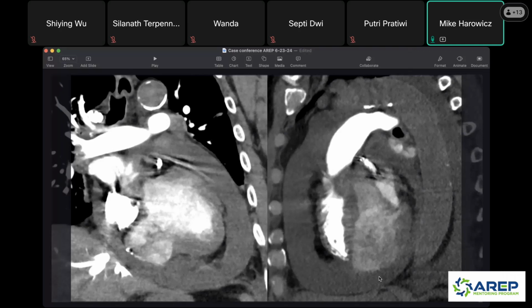These post-infarct ruptures. Sometimes you could rupture into the pericardium, such as in this case with a huge pericardial effusion. Sometimes you rupture and contain yourself, right? There was that one that was very big that was just sort of next to the heart. And sometimes you can rupture into other chambers in your heart, like a post-infarct ventricular septal defect. But if you don't scroll all the way through your heart, and if you don't evaluate each chamber, it's very easy to miss some of these findings.